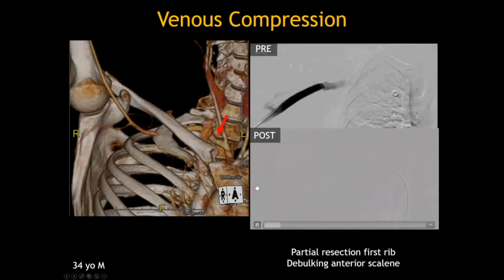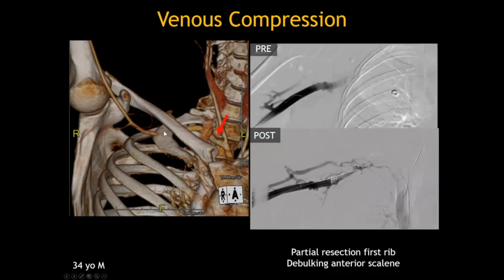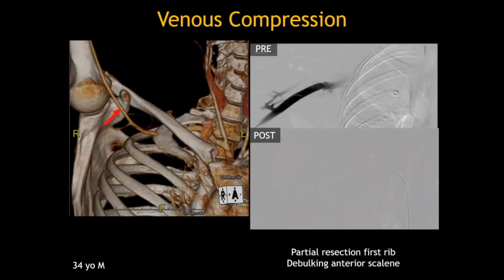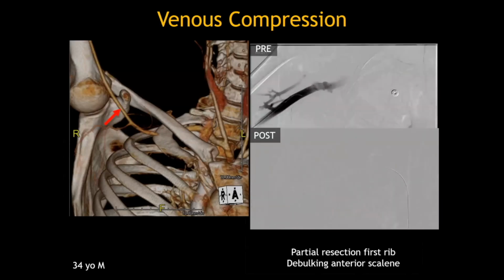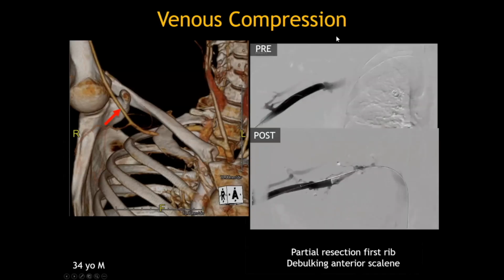And interestingly enough, this patient also underwent a CT angiogram, and you can see with the arm elevated that there's a focal occlusion of that subclavian artery. Actually, this patient didn't have any arterial symptoms. That is, there were no symptoms of distal emboli or ischemic changes. This was just a finding that we happened to see that was positional on CT angiography.